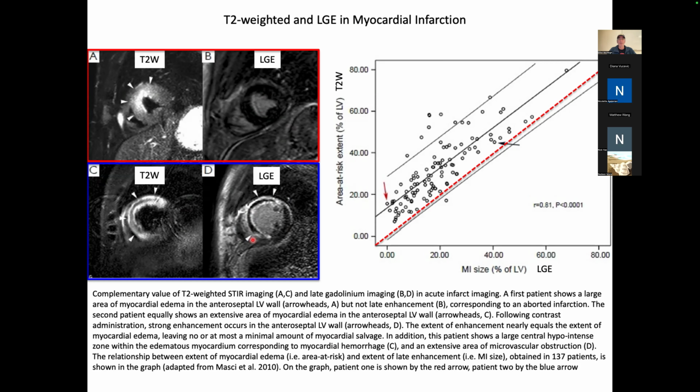probably within a couple of years will be on the transplant list, because this is probably going to fail the heart. There's an interesting artifact here. As you can see, these edges here are a ghost image of this heart. This is the direction of the Y phase encoding pulse. And what's happened is that every other data point has some kind of phase shift or change on it, and that produces this ghost image at 1/2 of the field of view.